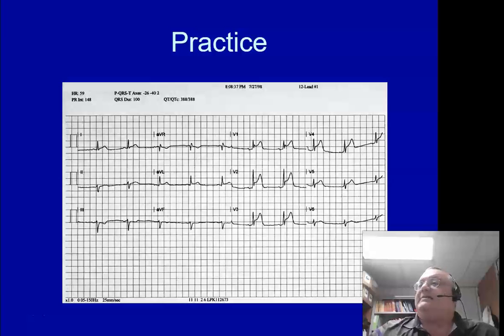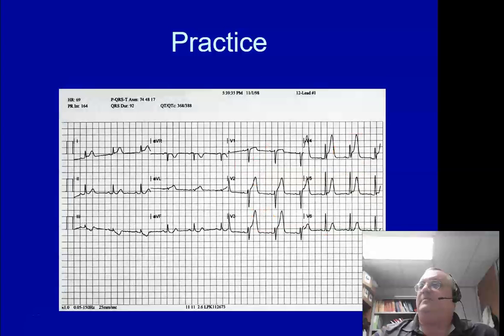All right, let's do a little practice here. Let's see here. Find the J point. Yep, that one looks bad. Yeah, that one looks bad. That one looks bad. Did I see any depressions in there? No, that one kind of looks bad though. Good enough for me. Let's see here. How about this one? It's starting to flatten out, but we'll call that right? But long and short, we got the septal wall, we got the anterior wall, we got probably starting to get part of the lateral wall. Yeah, good enough for me. I would say, yeah, it's time to wake up somebody.